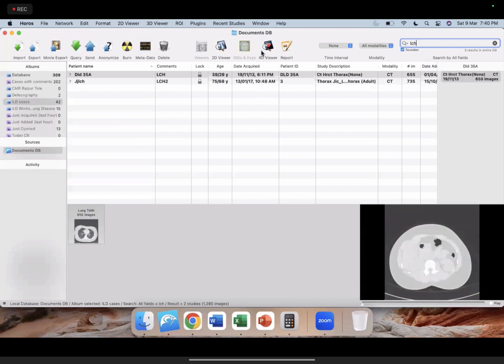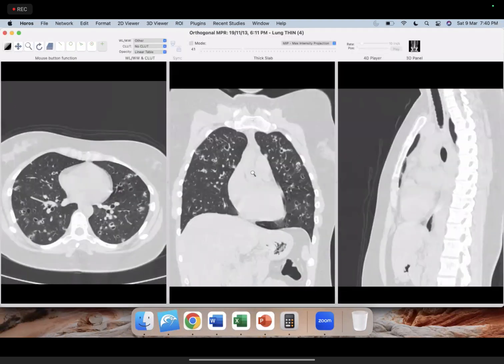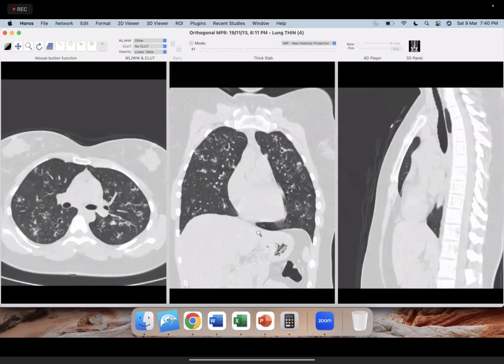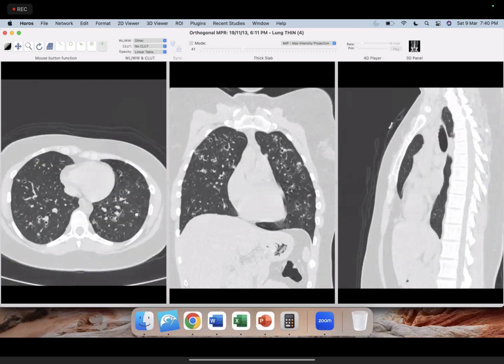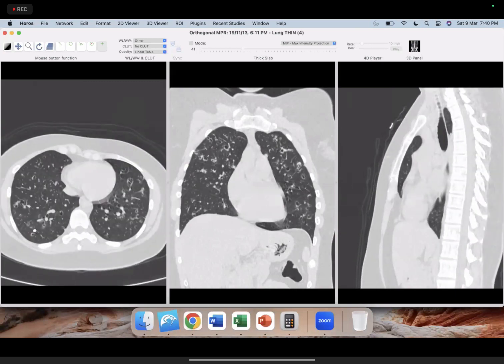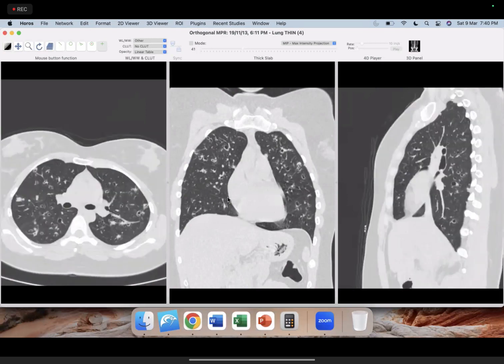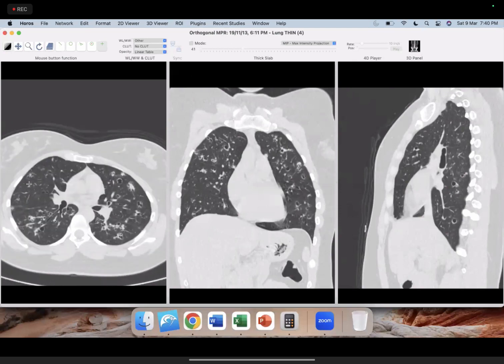Then this is an example of another type, now we are looking at some of the cystic lung diseases. Now what do we see here? So again, first note this patient is a female, right? Plus you see some cysts, some nodules. Now is the intervening lung parenchyma normal? No, you see nodules and branching type lesions also, and some ground glass. You see some cysts which are thin walled, and some cysts which look thick walled also, and then you see that the costophrenic angles are actually spared.